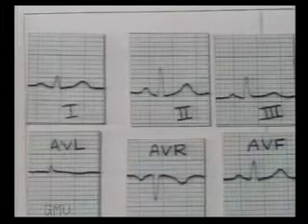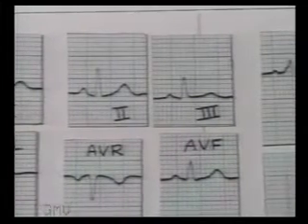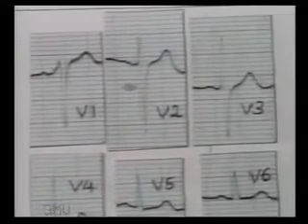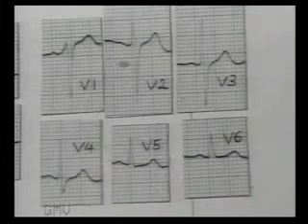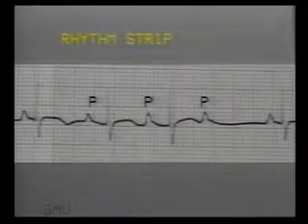Next we come to the ST segment. If the ST segment is elevated or depressed, the pattern must be studied and clinically correlated to myocardial infarction, myocardial ischemia, pericarditis and ventricular strain patterns. Lastly, we study the T wave morphology and note the leads where it is tall, flat or inverted. The details of STT changes are studied in the next section of this cassette.